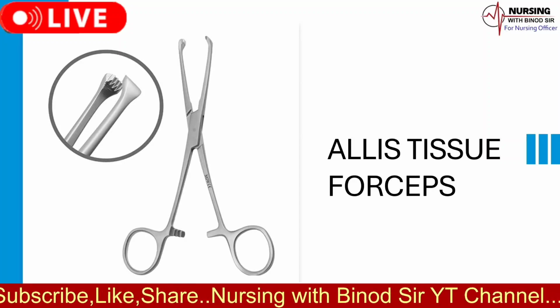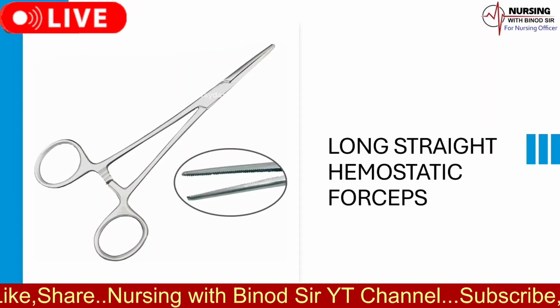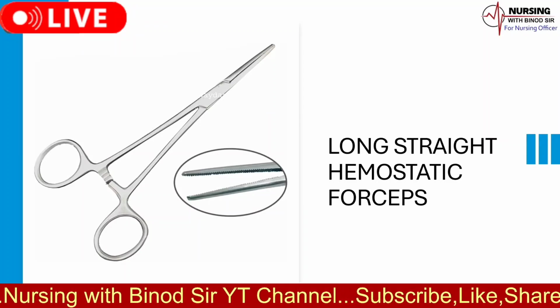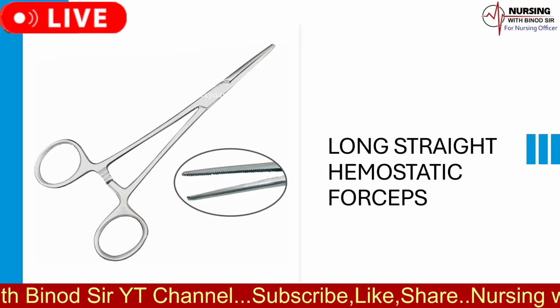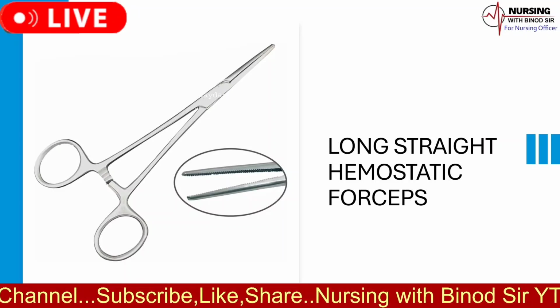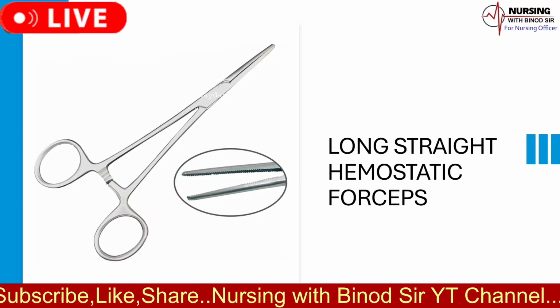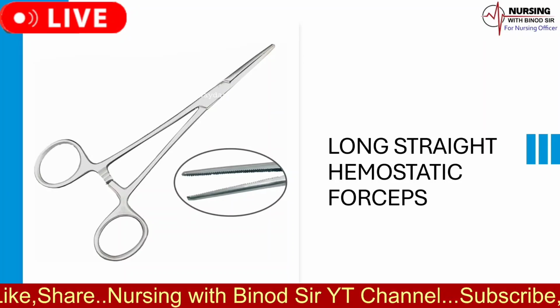Hemostatic clamp. The name of the instrument is long straight hemostatic forceps. The uses of long straight hemostatic forceps are as follows. 1. This is not commonly used in obstetrics. 2. It can be used to clamp the pedicle while removing the uterus, as in rupture uterus. The umbilical cord may be clamped as an alternative to Kocher's.